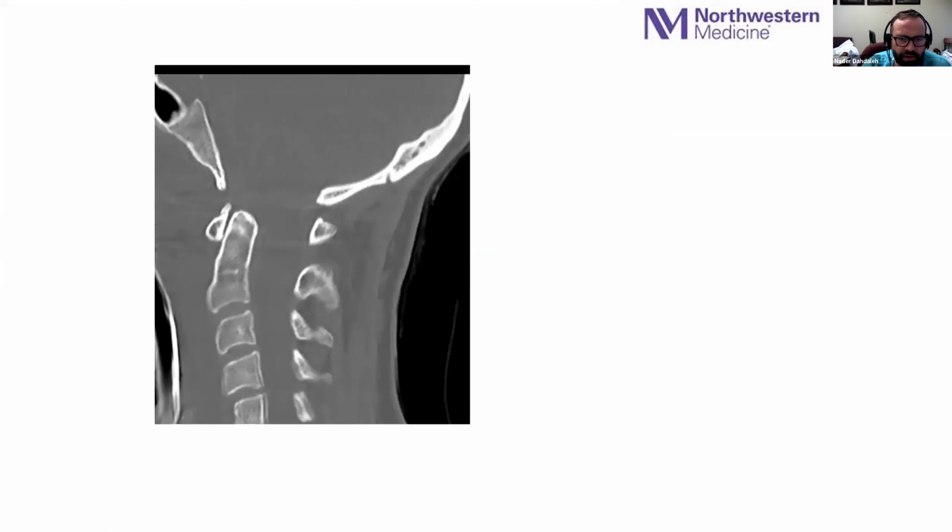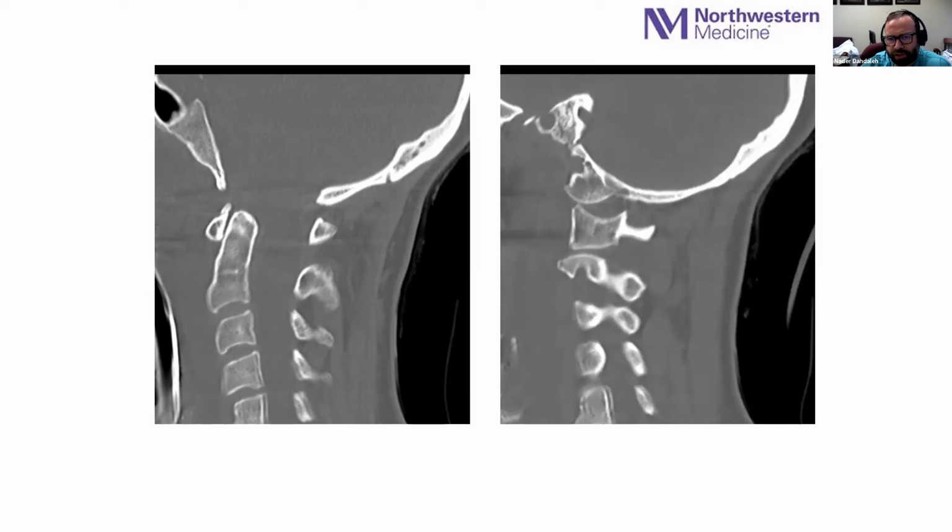That's the CAT scan that was obtained. It goes down to T1, but that's the area of interest. Do you see anything that stands out here? And here Alex has joined us as well, with this lateral or sagittal CT. Well, it doesn't show much. Maybe the BDI is a little elevated, but not really. So we're looking here at the parasagittals. Do you see anything that stands out?